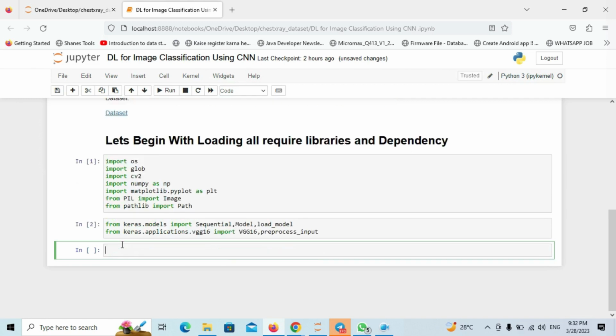I will now tell you about the other libraries. These are deprecated ones, so you have to import them using TensorFlow. If you don't do this, it will not work. I am making this clear because I have seen several tutorials on YouTube that say this will work, but it will not work.